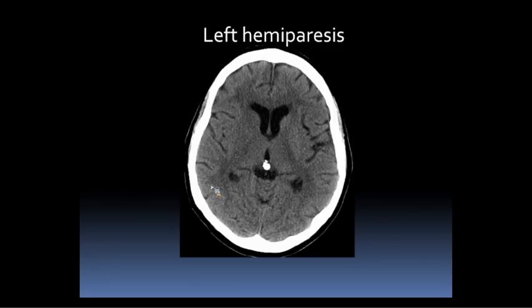So this is a really subtle one, and it's one that radiology residents miss all the time when they're starting out. And this is the vanishing basal ganglia. So essentially, what we're seeing here is, on the normal side, you see this density here for the caudate head and for the putamen, and you can see in relief the internal capsule here. So this is white matter, but this all looks the density of white matter here. So you really can't see distinctly the density of the caudate head or the putamen here. So this is essentially deep loss of gray white matter differentiation rather than cortical loss of gray white matter differentiation. So we're essentially just missing the basal ganglia on one side.